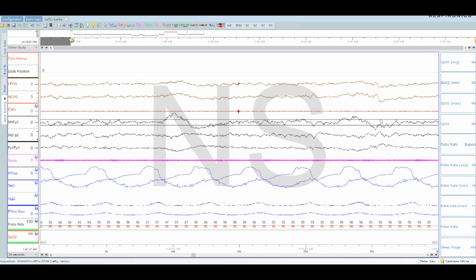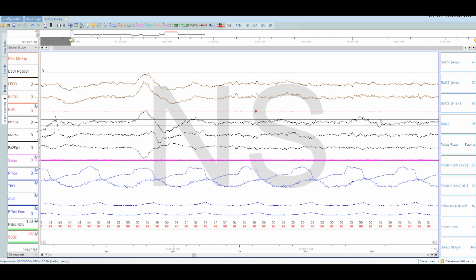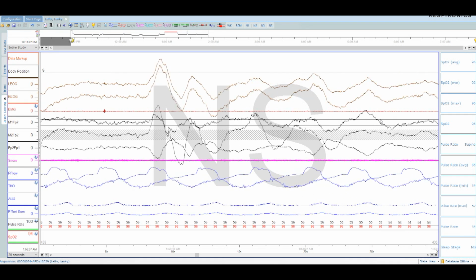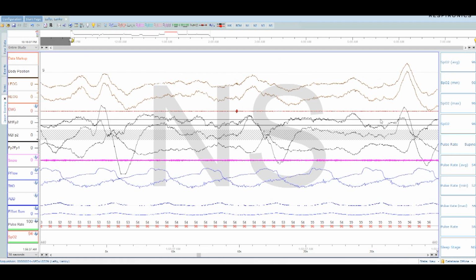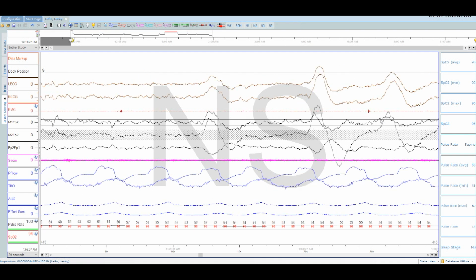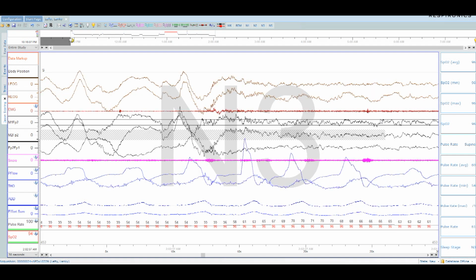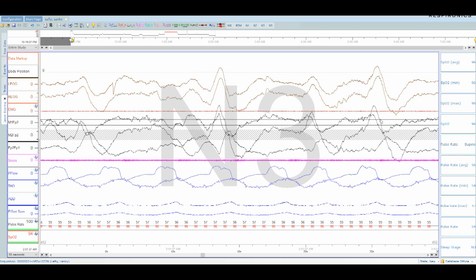So I'm going to do another one of these. I'll probably just cut this video off as soon as I'm done staging it, which, God bless, I have a lot. I need to get cracking here. Back into Delta. Holy smokes. Stage 3. When I'm done with this guy, I'm going to have a bunch of appointments today, so I probably won't even get to do the other one today.